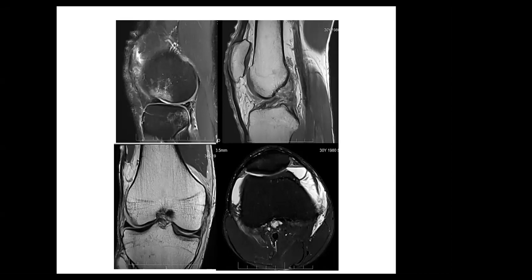The PCL is not clear here. I think it's PCL rupture. There is plica in the axial view.